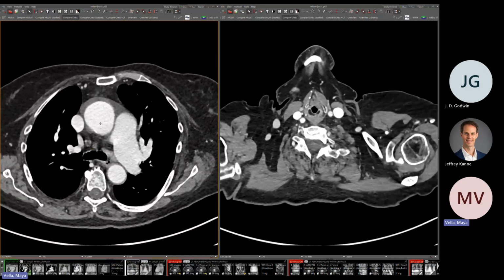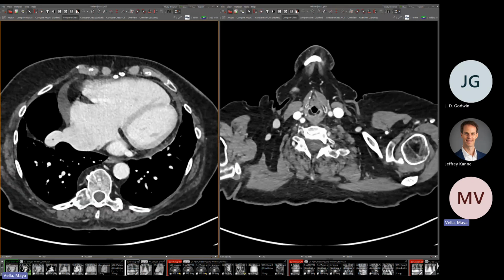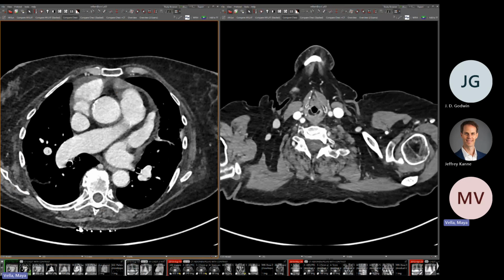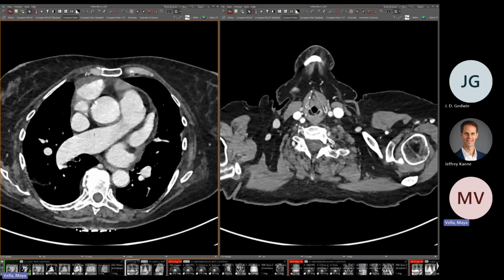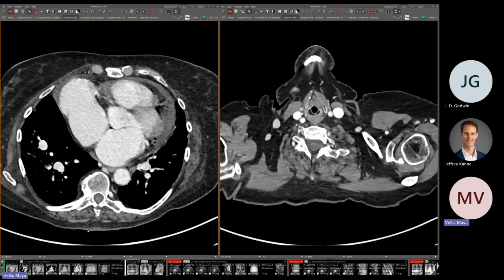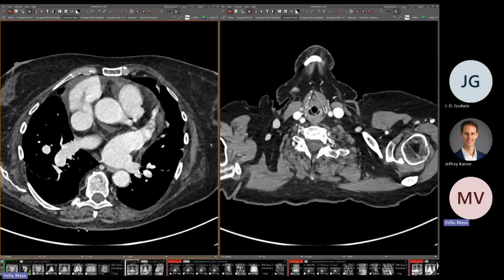And this patient is actually in their 80s, and they're getting their chest CT because they have shortness of breath. So here we can see that vein nicely draining into the supradiaphragmatic portion of the IVC. And if we track it back upwards, we can see that it's draining, honestly, the majority of the right lung. If we come back to the left atrium, we see that there's not really any normal veins draining into the atrium on the right-hand side, but the left-hand veins are normal. It looks like there might be a tiny one inferiorly. Yeah, like this little squiggly guy.